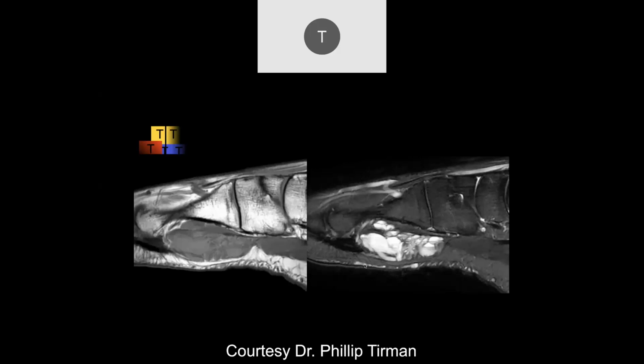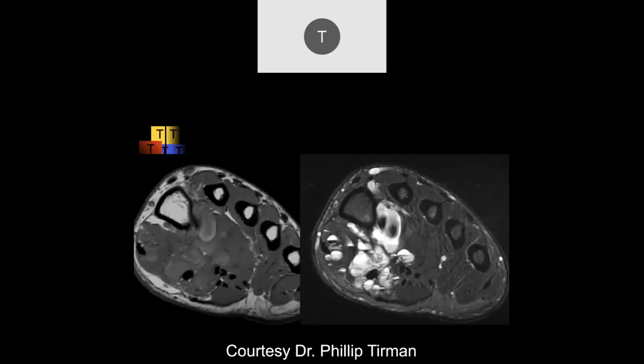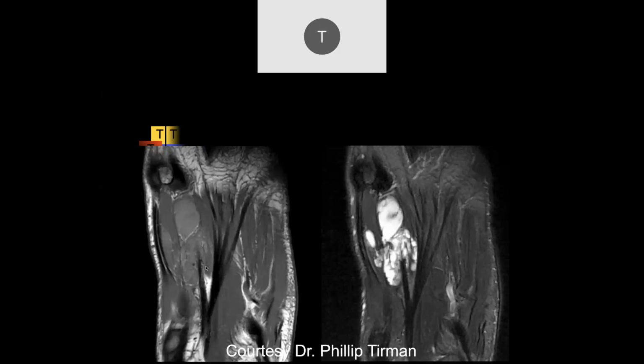Thanks, Tayson. All right. So looks like plantar to the forefoot. We have a lobular lesion with multiple fluid levels. Makes me think of some vascular, maybe, so it's kind of different here. It's very regularly marginated. I don't know, is this some sort of lymphatic malformation? You have fluid levels.